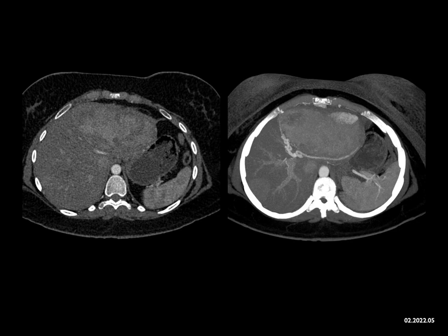FNH is the thought, but then the lesions typically are more homogeneous in terms of enhancing. And the way the vessel is stretched, it would be less common. With FNH, there often is a central vessel going into the lesion because there's a central scar, but we don't see a central scar here. Angiosarcomas are irregular and really hypervascular, and they're very rare tumors, but the hypervascularity and the bright blush is something we don't see here. This is a great example of hepatic adenoma.